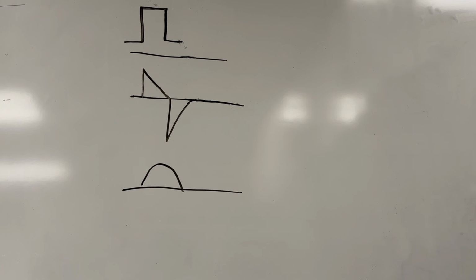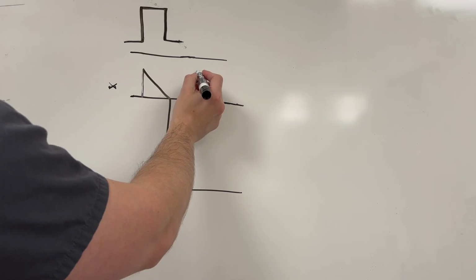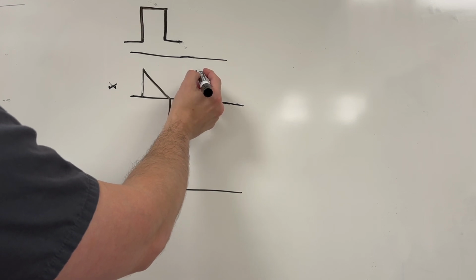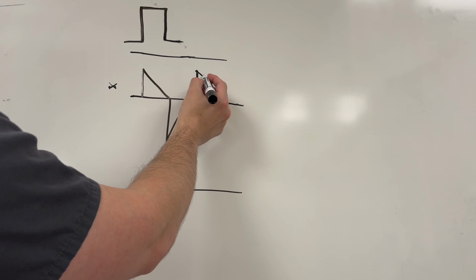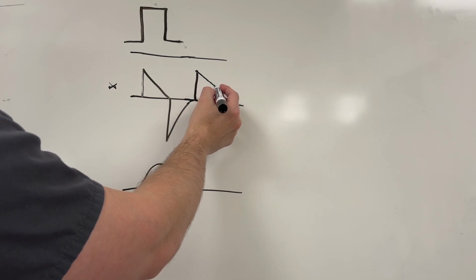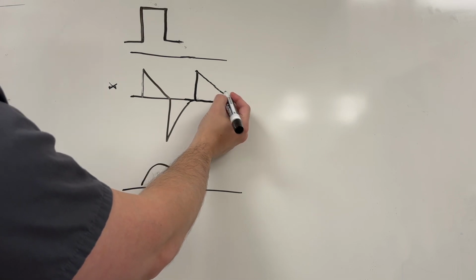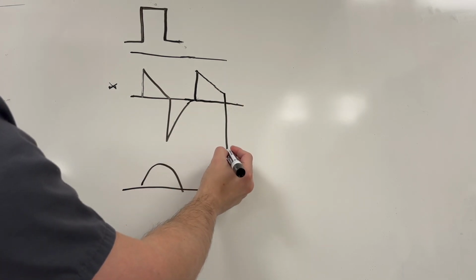Next, we're going to go over what it looks like if your I time for mandatory breaths is set too short. And where you're going to see that is on your flow waveform. And as this inspiration starts, again, we go straight up. And then when we hit our peak inspiratory flow, the amount of movement inside our lungs is going to slow and slow and slow at a decelerating pace as we're heading towards zero flow. But if our I time is set too short, we won't reach zero flow before we go into exhalation.